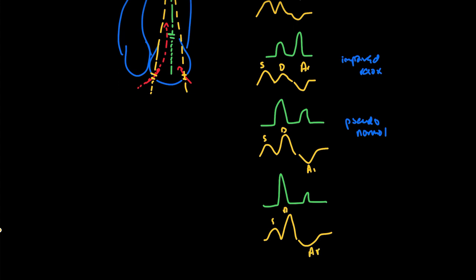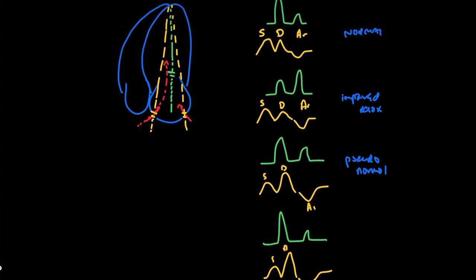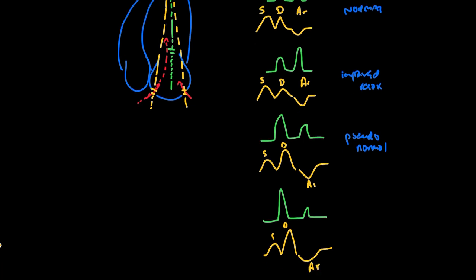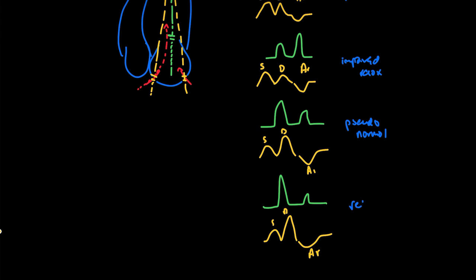And you see how in each of these, your E wave and your D wave are two ways of looking at the same thing, right? The blood that flows in during diastole into the left atrium, that's the same blood, unless it's going somewhere else, like through an ASD or something bizarre. That same blood then rushes in through the open mitral valve into the left ventricle. And so if we draw a line right here, apologies, let me label. So this was restrictive filling.